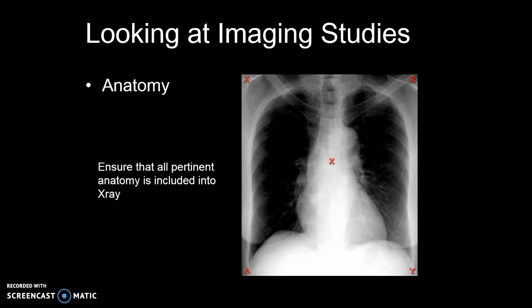When looking at the anatomy of a chest x-ray, confirm that all lung fields are showing. Ensure that both complete costophrenic angles are present. If the edges have blunting, it can indicate pleural effusion or fibrosis. Do not exclude these diagnoses by not having a complete image.